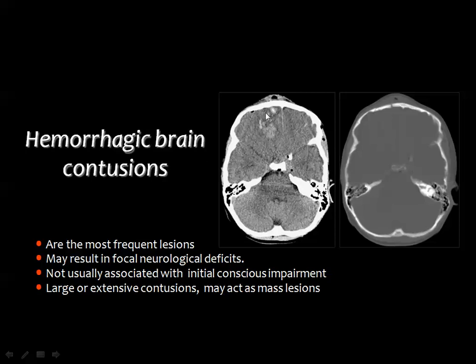If you don't see hemorrhage and you say this is brain contusion, you know that this contusion should be hemorrhagic, in spite of not seeing the hemorrhage in the scan. Then the hemorrhagic contusions are usually related to the site of trauma, which is indicated by the presence of a calvarial fracture like this one, and also the presence of a subgaleal hematoma localized at the site of injury.